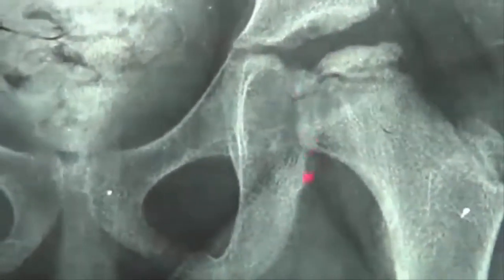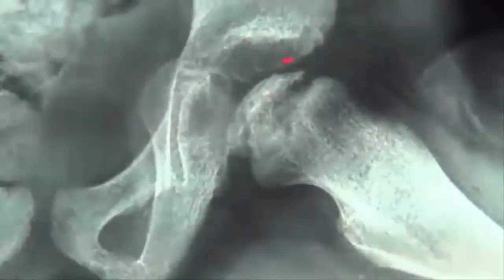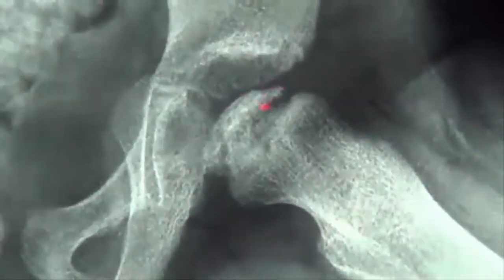And that's why we were very worried, and we also asked for the frog position that is here, and you can see this is almost all the head of the femur very badly affected. This is really clear if you compare again with the other side, which has a normal height, is round and very well centered in this frog position. This has a very wide space between the acetabulum and the femur.